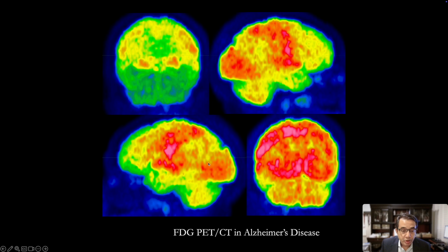In the left lateral projection, the left parietal and temporal lobes show hypometabolism, and the uptake right next to it anteriorly is a sensory motor cortex, which shows preserved uptake. Subcortical nuclei are somewhere there, which we saw earlier, and then normal uptake in the occipital cortex. So this combination of findings is consistent with Alzheimer's disease.